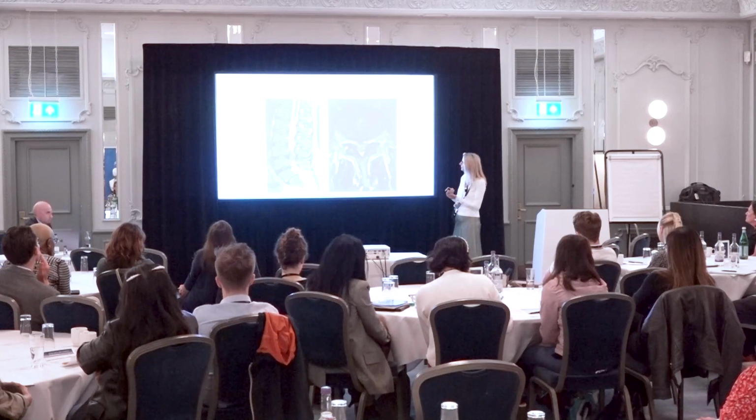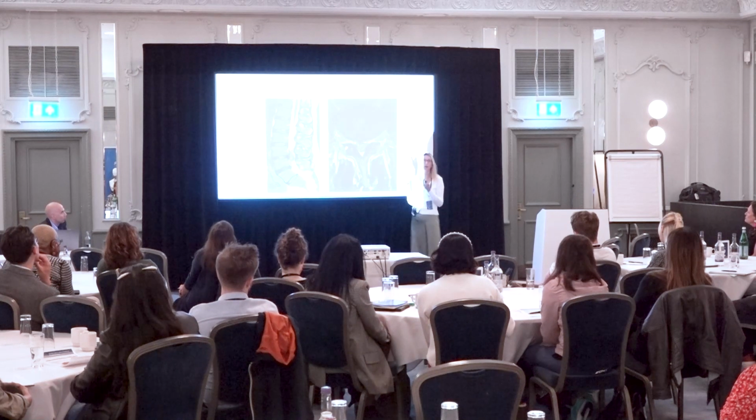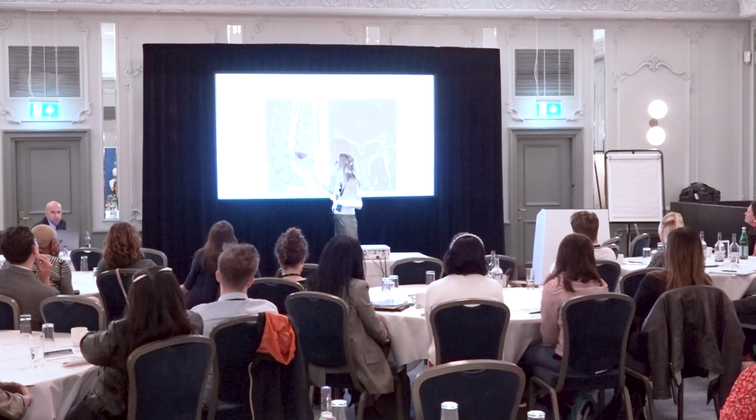This is another case of cauda equina syndrome presentation. We do a scan. You can see that here you've got complete obliteration of CSF. You've got very severe spinal stenosis. What's also important in this patient is something we see very commonly, and that is that some people constitutionally have a narrow canal. And that is because the pedicles are just genetically a little bit shorter, and along with that you have quite a lot of epidural fat behind.